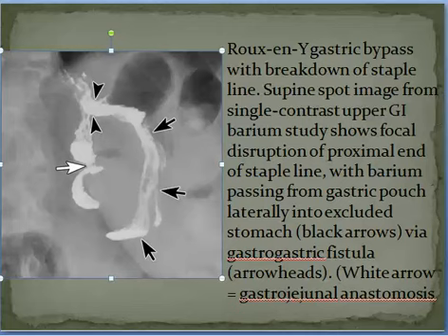Via the gastric fistula. You remember that between the pouch of the stomach, which is connected afterwards to the jejunum, there is the excluded stomach. This should be excluded. Now one of the staples here is broken, it's not there. There is interruption of the staple line, so barium comes into the excluded stomach. So simple.